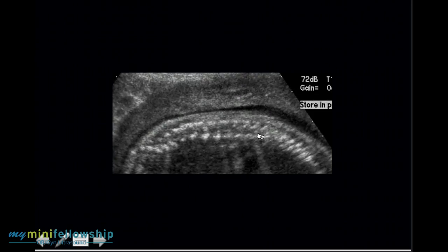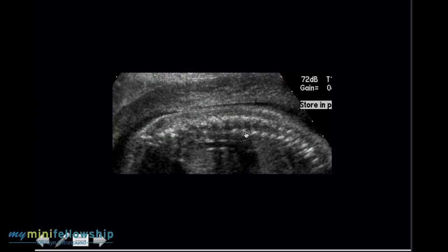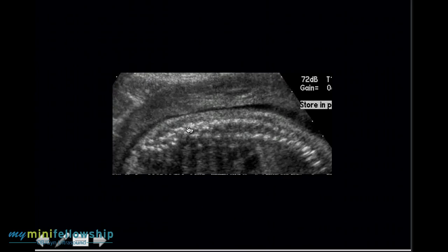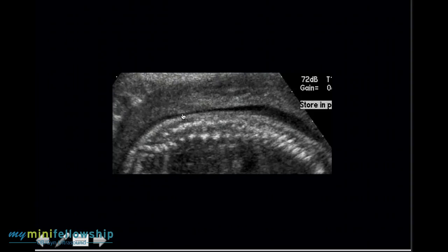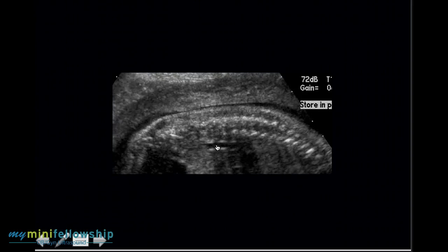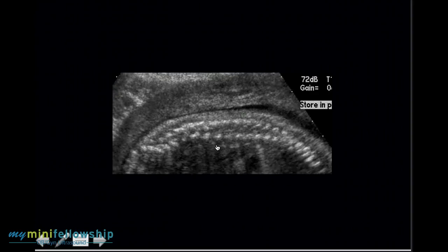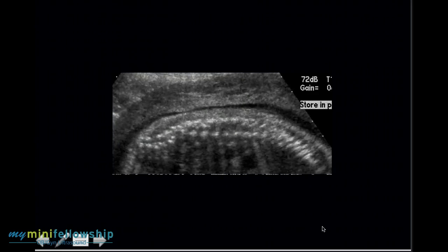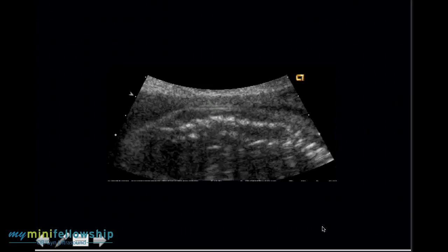So I always let my eye flow along this line of the dorsal aspect of the vertebral bodies. And when you get to here, they just... The dorsal aspect, not the... You could use either one, but because you're getting some shadowing of the downside, you're better off using the dorsal side. Good tip. So you can see they're just out of line. That means a segmentation abnormality.